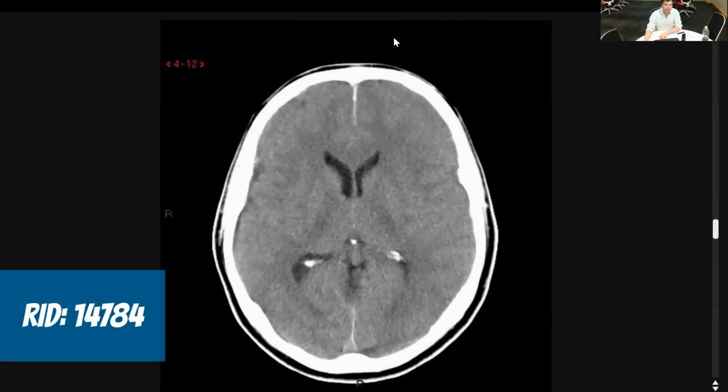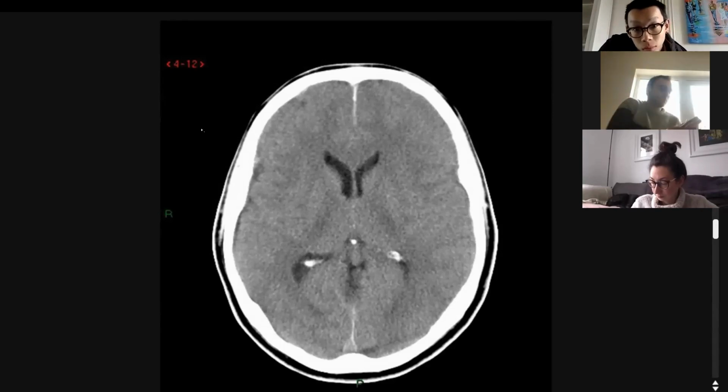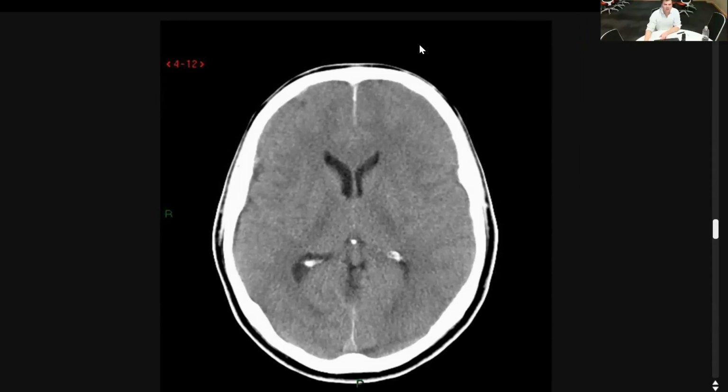Now, let's see. No one's had a look at this one yet. Laura, following on from you. You there? Yeah, hi. Yeah, cool. So let's give you that. Have a look at this head. Tell us what you think's going on.